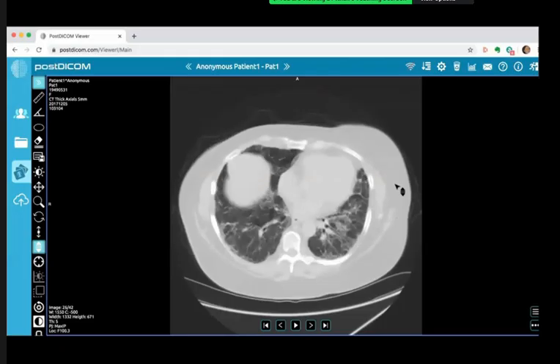Yes, that's exactly right. So this is the head cheese sign, actually, for chronic hypersensitivity pneumonitis. So we've got three densities here. You've got ground glass, you've got normal lung, and you have these areas of air trapping.